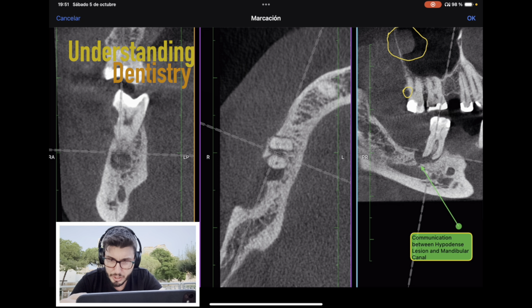We have a cervical lesion and distal marginal bone loss here, of course. There is the hyperdense alteration, so a metallic restoration here. And then we have this situation here, but you guys know that this is CBCT and we might have metallic artifacts affecting the diagnosis of this area, of the tooth 1-6. Now, if you want to read more about these artifacts, the keyword is beam hardening artifacts. The metallic artifacts from a CBCT are usually called beam hardening artifacts.